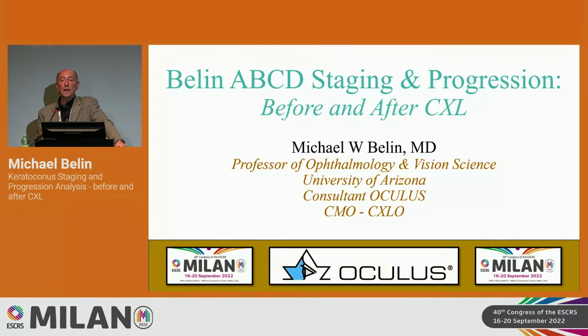So what I'm going to be talking about today is the Belin ABCD staging and progression display, particularly the latest iteration of the display, which includes the post-crosslinking data.